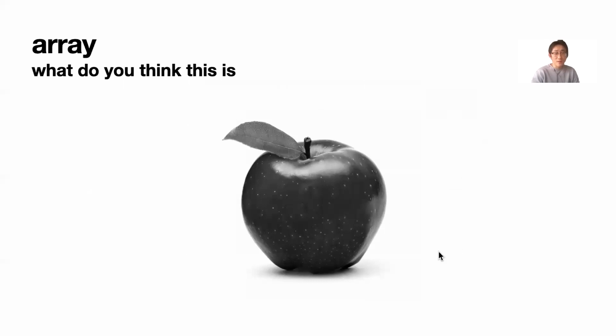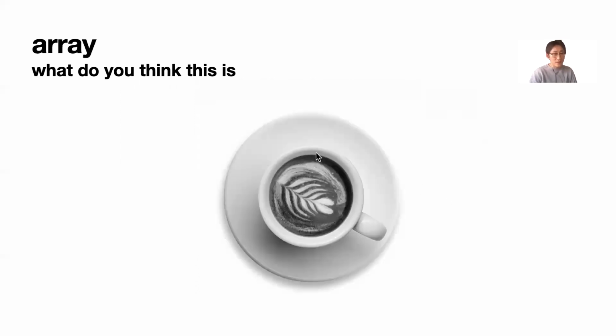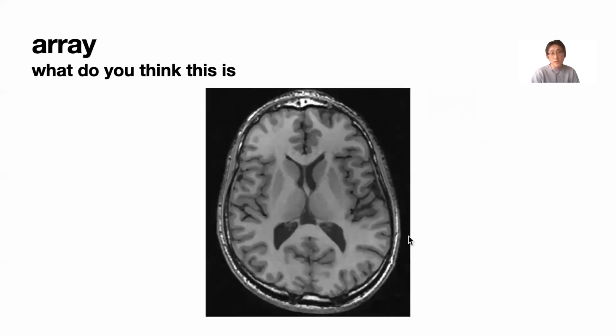Now, what do you see? It is an apple, but it's also numbers arranged in an array. All right, quite dark here, so lower numbers would be here. Quite bright, so a little bit higher numbers around here, and probably mid numbers between them. Okay, right. So what do you think this is? Espresso cup, right? But it's numbers in an array. So high is very bright here, so a higher number, and coffee is a little bit dark, so it's a low number. Okay, the same logic applies to an MRI image.